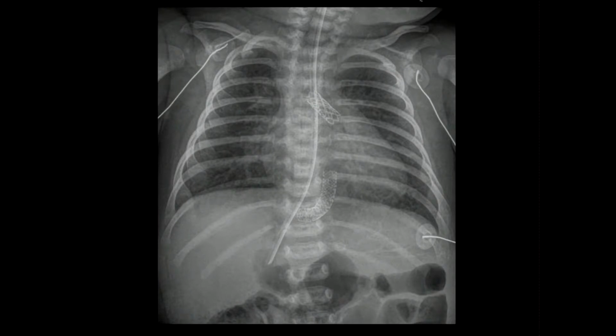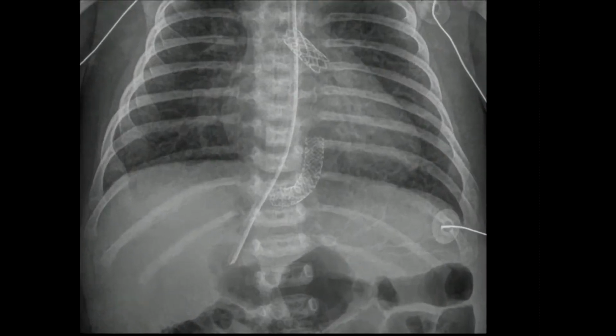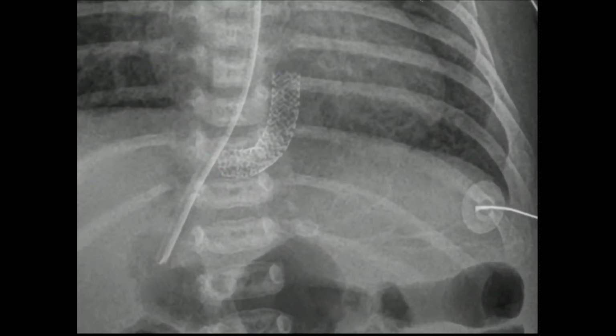And then in reading the plain film, I saw this, some opaque branch-like opacification. In the beginning, I thought that this should be an artifact, like cloth outside. However, if I look at this, these are all really tree-like, and it's unlikely to be an artifact. So I suggested calcified thrombus in the left portal vein. And then this is the close-up, okay?